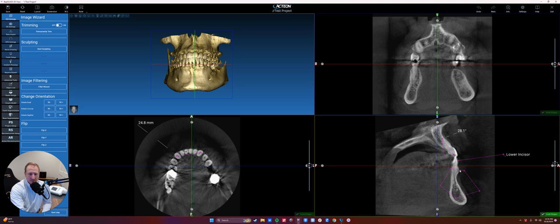The ROI gives us a pentagon. And when we're done with the ROI, there's a little button on the bottom that says Finish Polygon. It's going to give us a number of pieces of information. So it's going to tell you the total area that you just selected, the perimeter distance, and it's going to give you the max and minimum Hounsfield units. So that might be really useful if you're looking for how dense is this area. Maybe you're looking at a bone graft. Maybe you're looking at the area for a larger bone graft or something similar to that. But that gives you a lot of information.